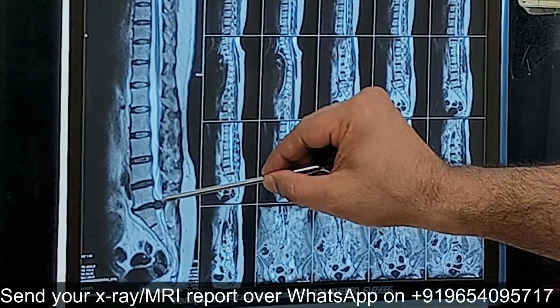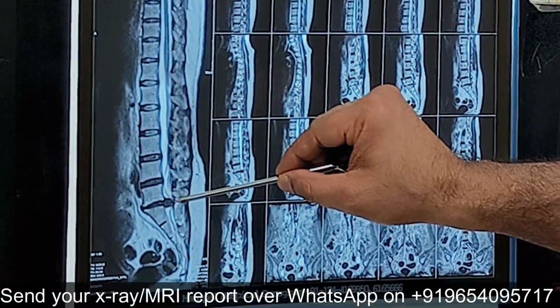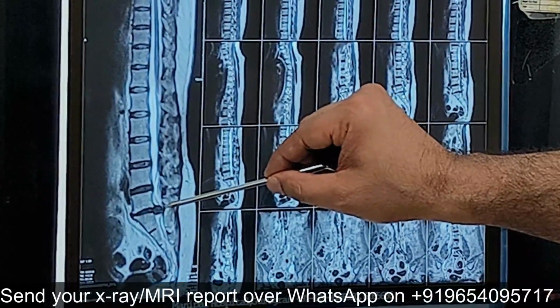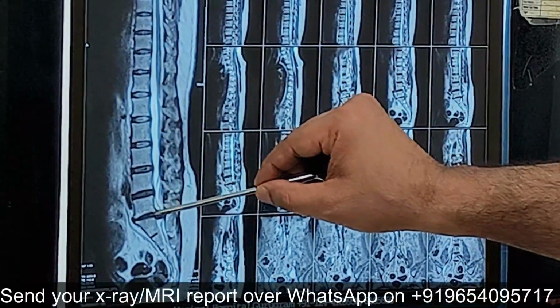Now this big disc part that has come towards the nerve and is pressing it might cause pain in the legs, or radicular pain, what we call it. It can cause numbness, tingling in the leg, or problems with the motor and urine nerves also.